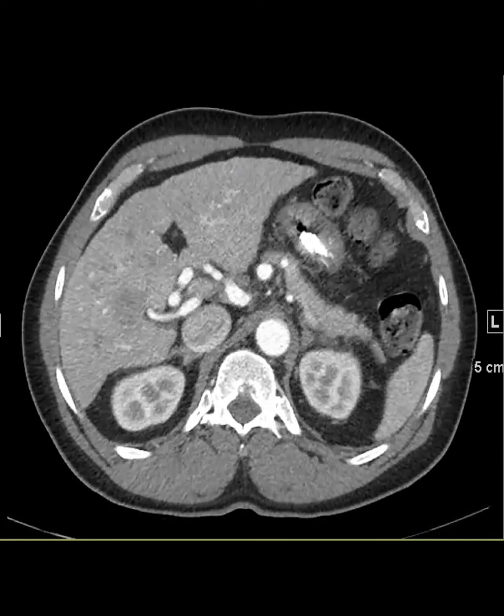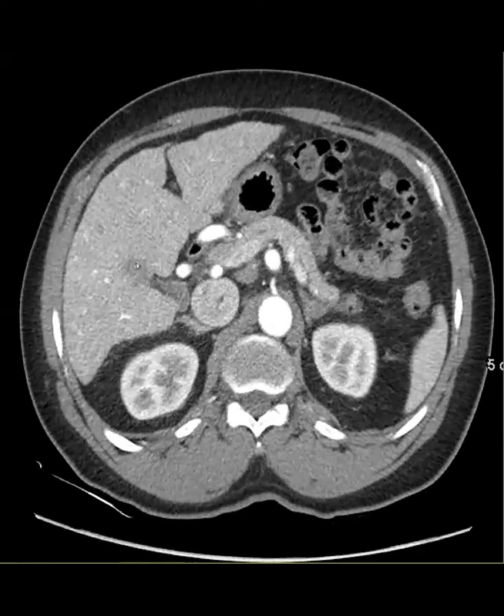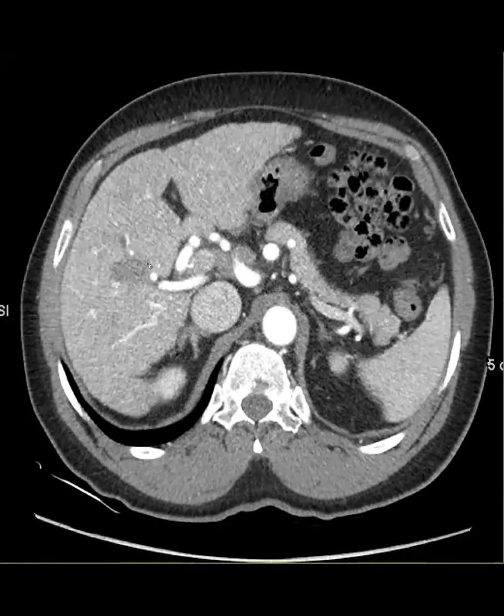So the patient came back 6 months later because probably focal fat indicates LI-RADS 2, so they went back for the 6-month follow-up. And again, the patient had this ill-defined lesion. Victoria, would you have recommended an MR for this?